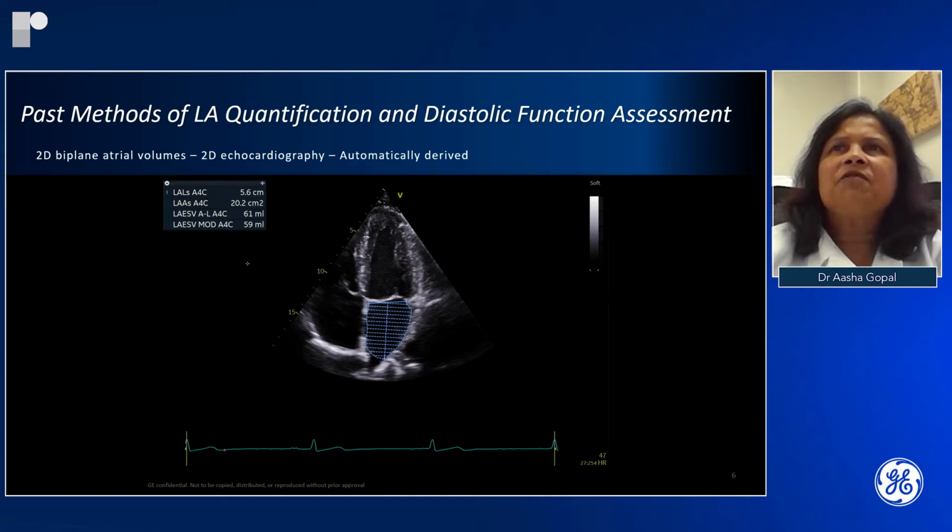So since the left atrium enlarges asymmetrically, the AP linear dimension by M-mode or 2D echocardiography underestimates left atrial volume. Using linear dimensions, left atrial enlargement was correctly diagnosed only 46% of the time, whereas left atrial volume increases that detection rate to 76%. Now, addition of other planes, a third plane, for example, improves the accuracy of volume estimation.